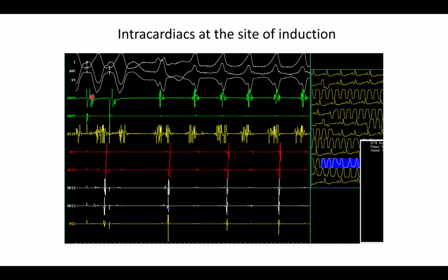So you have paced from the ventricle and stopped, and you can see here, even in the Holter, a wide QRS tachycardia induced. This is a wide QRS tachycardia. Where can you see? These are V's, and these big signals are A's. So one, it is V's more than A. Whenever we say V more than A, chances of VT are very, very high. It's a VT, that is one.